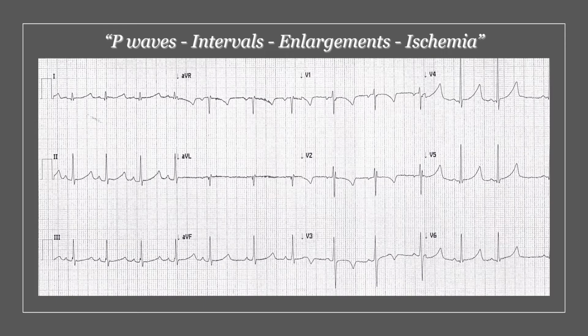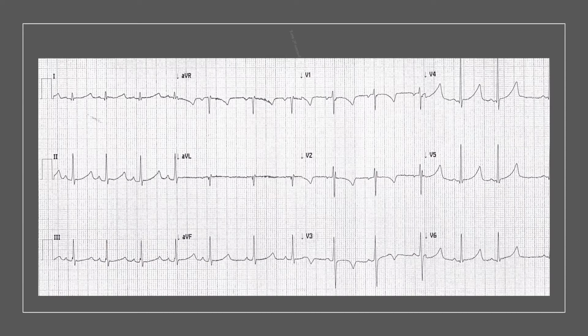The only thing that we haven't mentioned yet in this ECG is the QT interval. To be honest, if you look at the QT interval here, just with your naked eyes, it looks really prolonged. So I think the concern in this ECG should be the long QT interval.